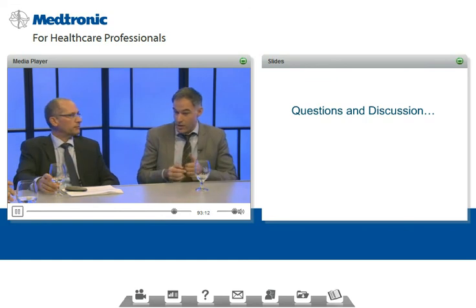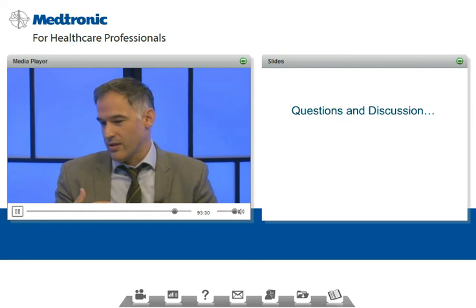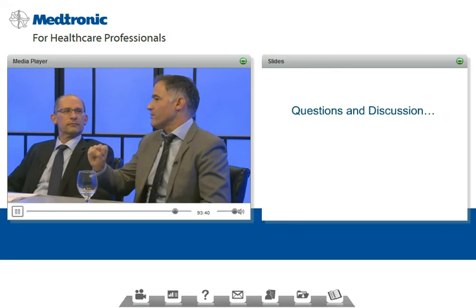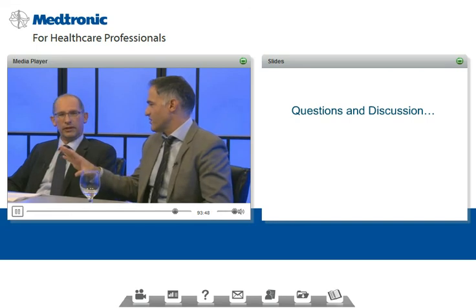For me, how does it change things? Well, I'm spending less time pushing people's pumps, button pushing to write down basal rates, carb ratios, correction ratios. It's right there on a device setting sheet. And then I get the overall picture of blood sugar control from the modal day average. And the other things, I have a quick view summary, which is more for my purposes, the modal day hourly, the device settings, the daily.